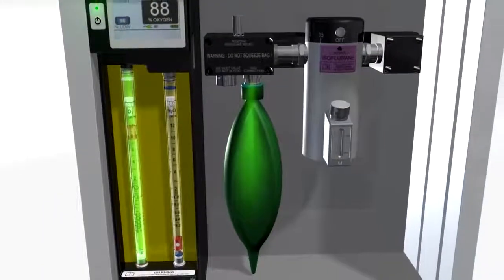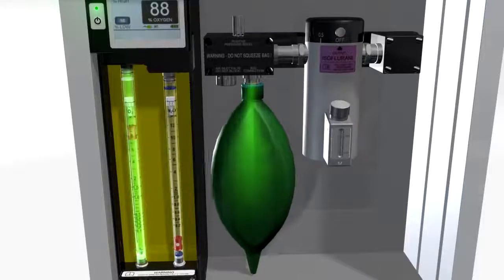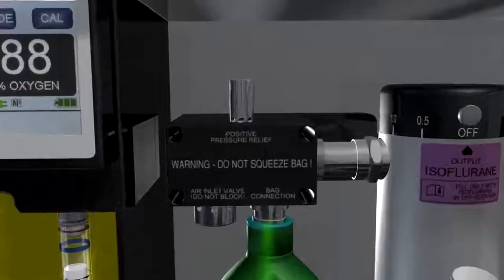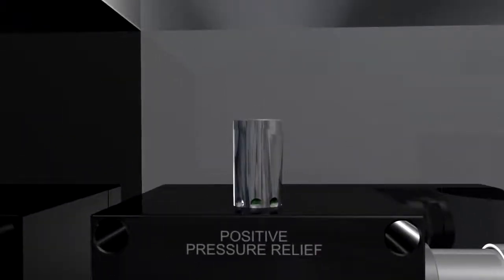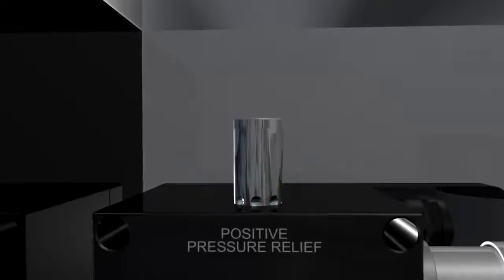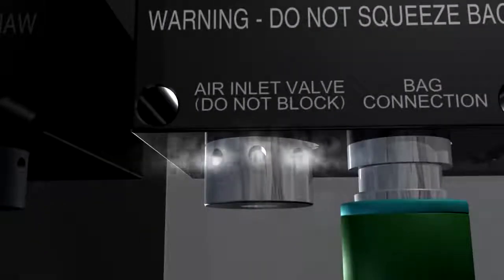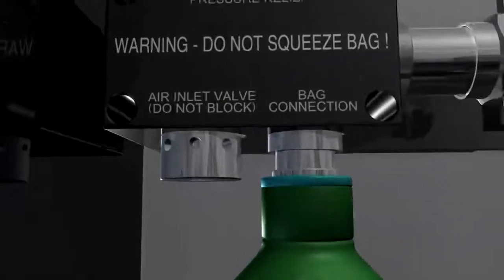The back bar serves three functions. First, the reservoir bag stores the oxygen. It holds up to 2 liters. Second, the pressure relief valve limits pressure in the back bar to 5 centimeters of water, protecting the patient from harm. Third, the air inlet valve allows room air to be drawn in whenever the supply of oxygen is less than the demand, as expressed by the patient's minute volume. We'll come back to this shortly.